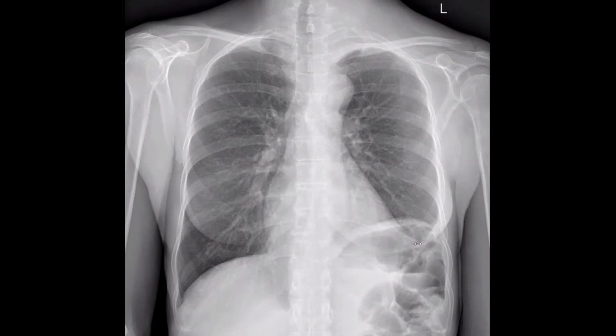So then I will check the rest of the bones. Well, the bones are clear. Yeah, you are right. You should check the bones, but I want to save your time. The bones are totally clear. Yeah. What else? Bones are clear.